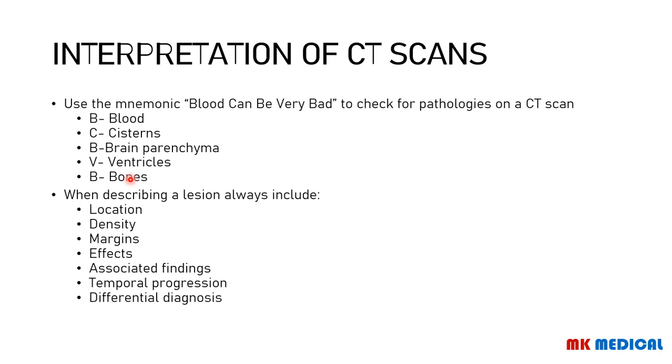If you see a pathology, you should comment on the location, the density, the margins, the effects, the associated findings, and the temporal progression, as well as give a differential diagnosis. Of course, you will get to learn more of this when you look at the different pathologies, and we'll be commenting on the different pathologies on the CT scan subsequently.